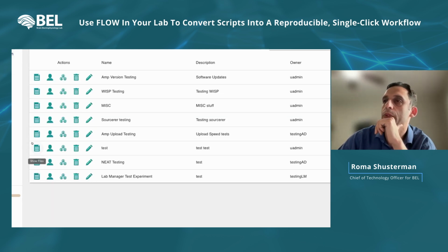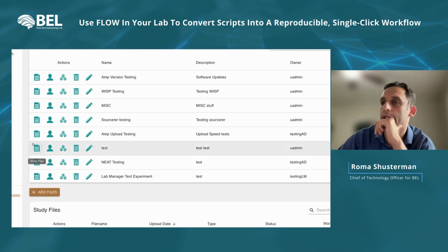In the meantime, I just wanted to show that we already loaded the original data set that we will run this on. The moment the APICE workflow is generated, we will run it on this input. This is from data provided by Dr. Lorenzo.